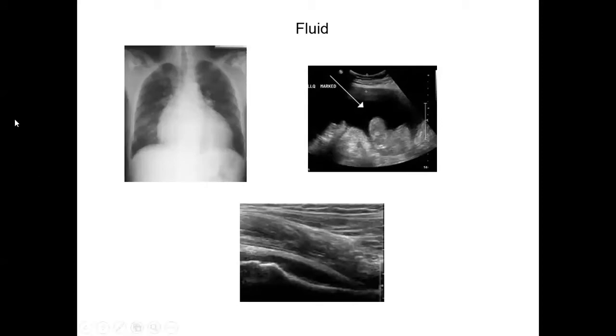On the left, we have a chest X-ray where the heart is enlarged, the cardiothoracic ratio is increased. We've done an echo, and it's a pericardial effusion. How could we describe a pericardial effusion diagnostically? Well, it's fluid, isn't it? So it's either a transudate or exudate. And if it's a transudate, we'll be thinking about systemic problems such as all the failures, heart failure, renal failure, liver failure, low oncotic pressure. Or if it's an exudate, it's exactly the same differential as in the chest. It's either infection or tumour. Again, we're repeating the same pathology.